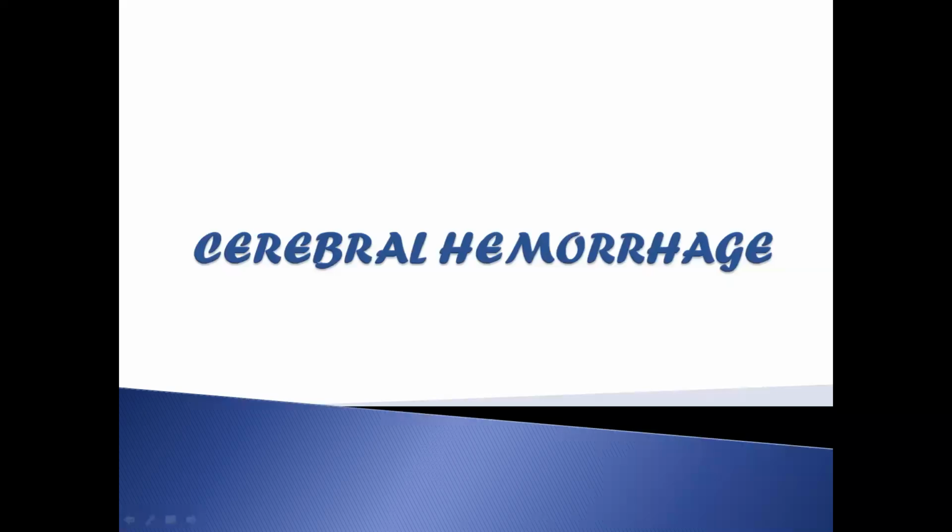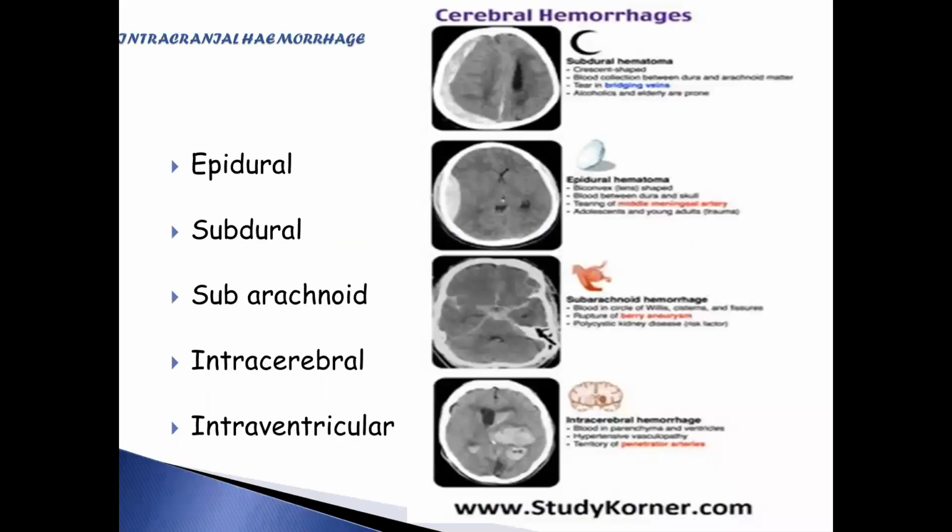Hello everyone, today we'll be talking about cerebral hemorrhage, so how to approach a CT scan that shows cerebral hemorrhage. The first video generally talked about how to approach a head CT. Then on this one we'll be more specifically talking about cerebral hemorrhage.